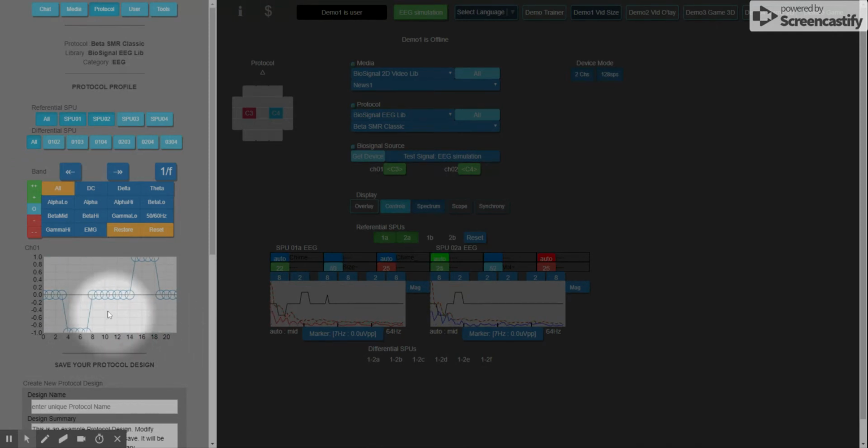To pick out one particular bin, we might want that one to be added to the inhibits, and that immediately gets reflected there as well. Let's double illustrate that. We can see it there. Okay, the other tools here.